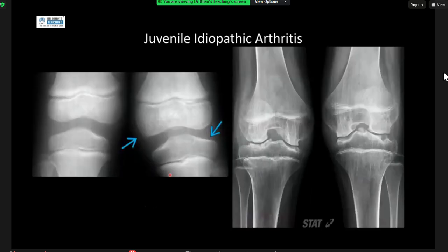So just some things to show you the difference. Here's a patient with both legs, one more affected with arthritis on the left and not on the right. You can see the epiphysis is a lot bigger on the distal femur, and the epiphysis as well. And then this is one that has bilateral JIA involvement of both knees, and you can see that widening of the intercondylar notch. To be fair, if you are just looking at asymmetry, if you're looking at symmetrical both sides without one to compare, then in the absence of other symptoms and purely isolated widened intercondylar notch, I think it's hard to pick up.